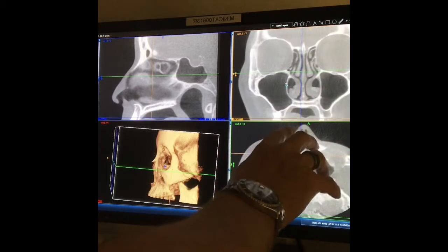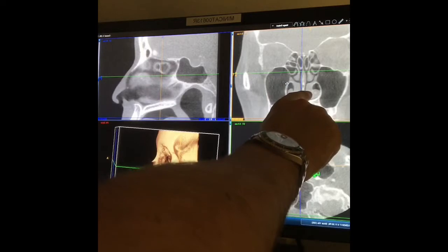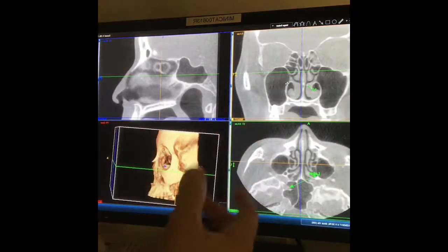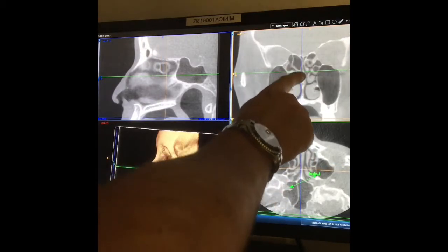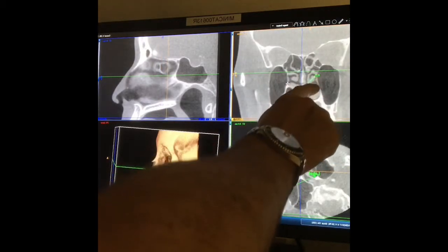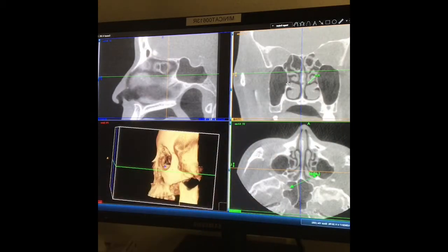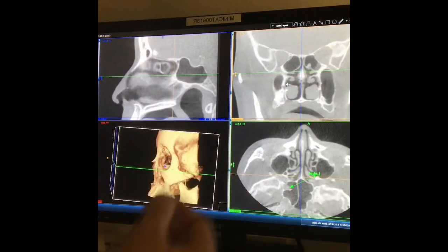Getting back deeper and deeper, straight septum, inferior turbinates here, and this one here has got a little bit of swelling that could cause her some nasal congestion or obstruction. As we move back further, these middle turbinates rotate around upon themselves, and so this is somewhat wide here, perhaps creating some more nasal airway obstruction. If that's a complaint of this patient, that could be why she's feeling that way.